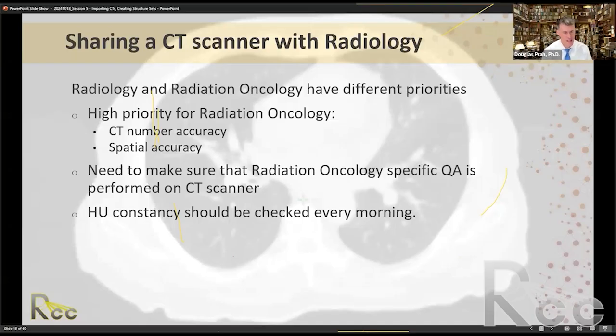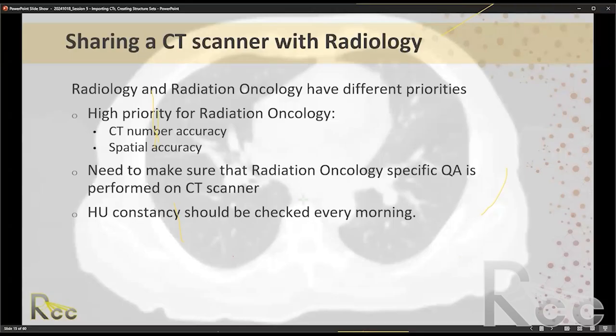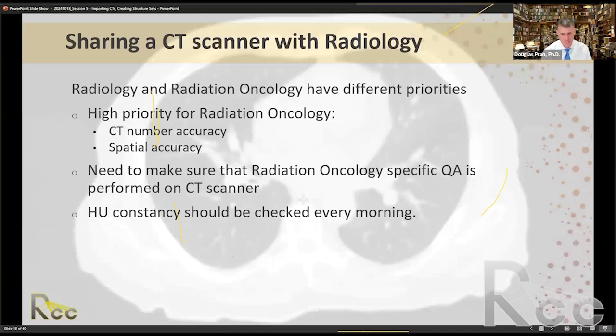Yeah, most scanners will let you do it after the fact. So you can just create a new reconstruction with the raw data and do it after the fact. There are exceptions. There's usually a standard field of view and then the extended field of view. If the patient is being clipped outside of the extended field of view, there's nothing you can do about that. So you might have to get creative.